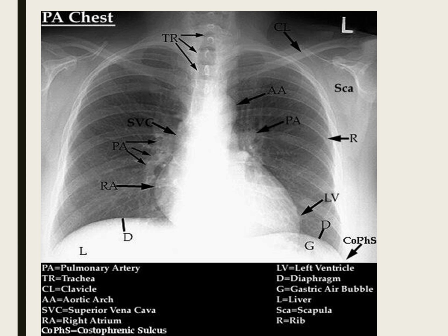D is the diaphragms, right and left. The right diaphragm should be slightly higher than the left one. Underneath the left you usually have a little gastric bubble. Can you see that? And why wouldn't you see the diaphragm? Fluid, so you can have fluid.